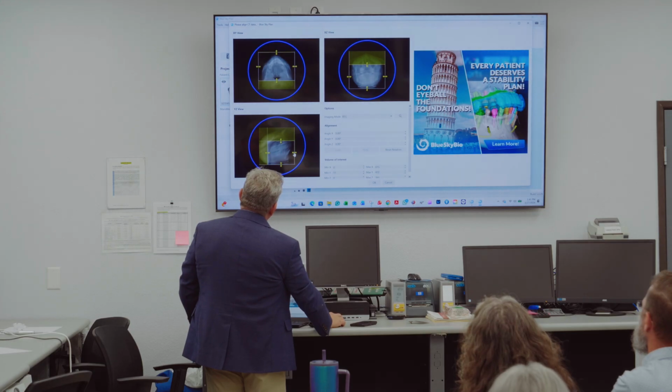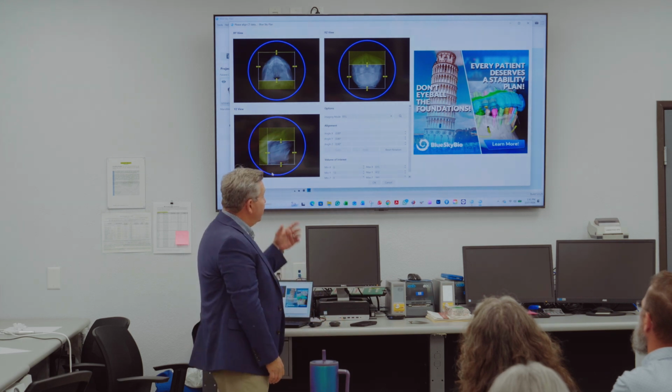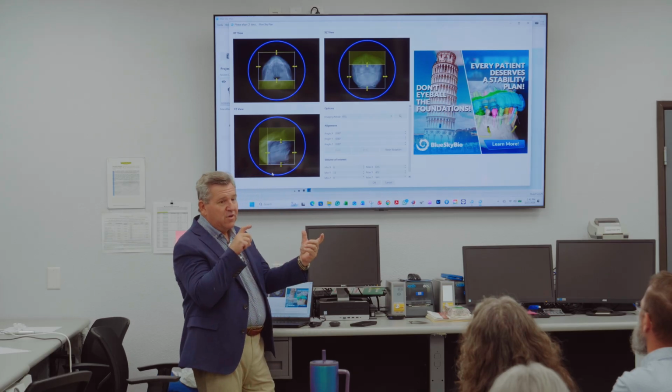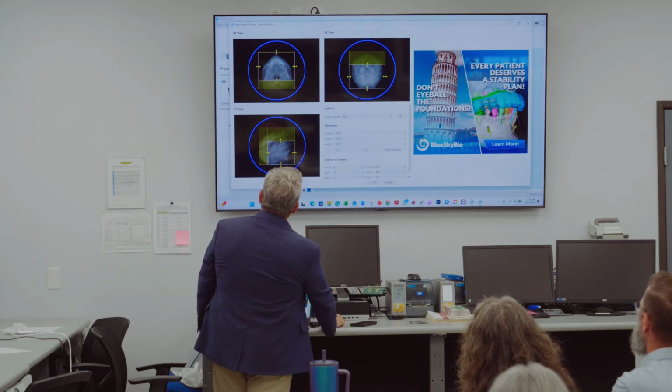If your computer does not have a very strong video card, just fair warning, at some point if the files are too big, it'll just crash on you. It'll just stop working and go back to the honeycomb screen. Okay? And you do the same up here. I think Corey mentioned you need a good gaming computer. They're $1,000.